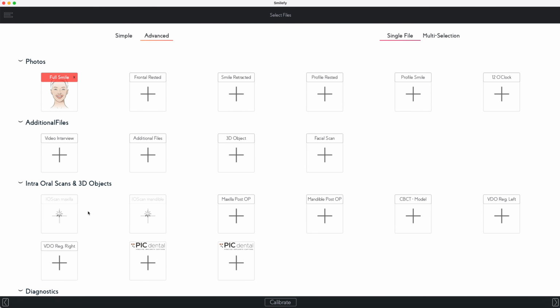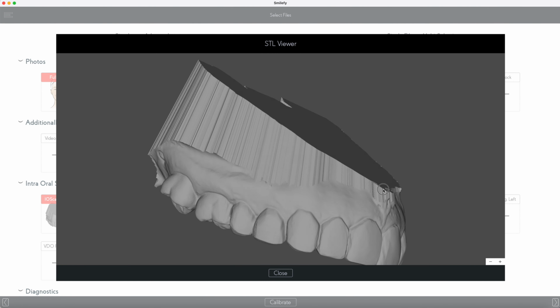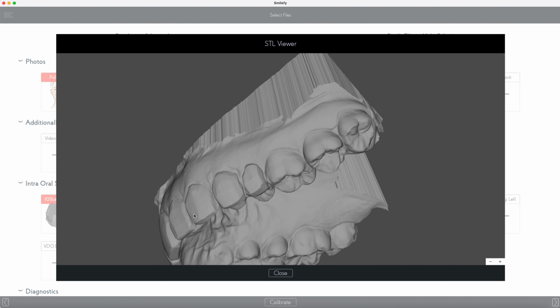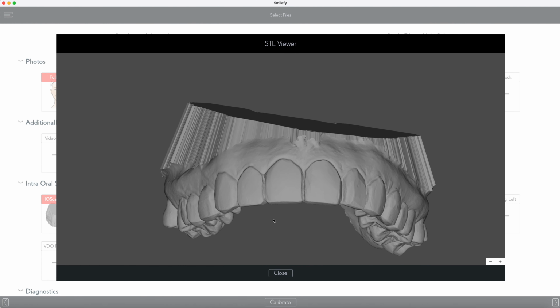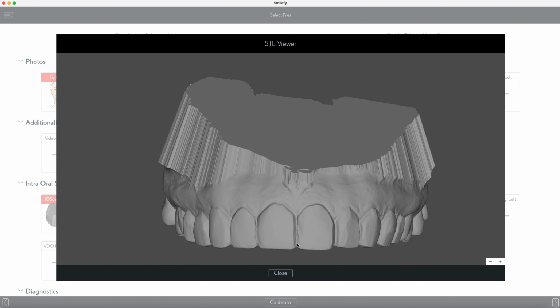We do have composite restorations like this. And now the challenge is to remove the composite layers digitally, of course, and redesign in a way that we can set only one appointment for the patient.